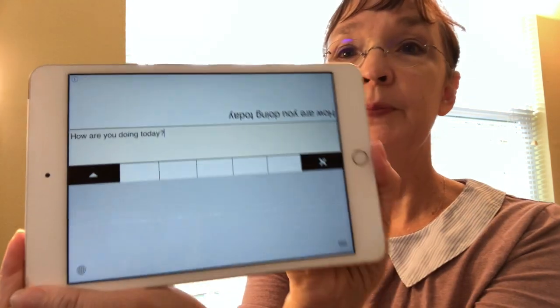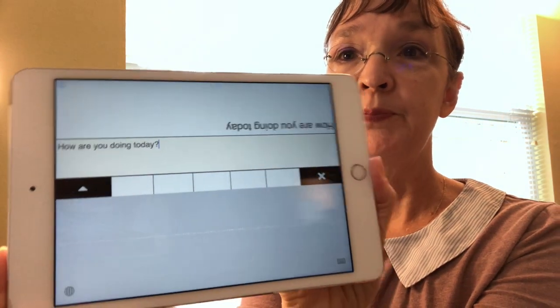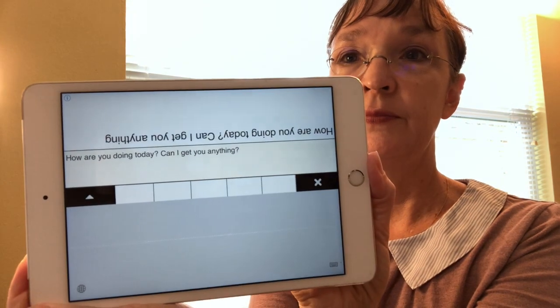How are you doing today? Question mark. Can I get you anything? Question mark. Can you tell me your pain level by showing me your fingers from 1 to 5? Question mark.